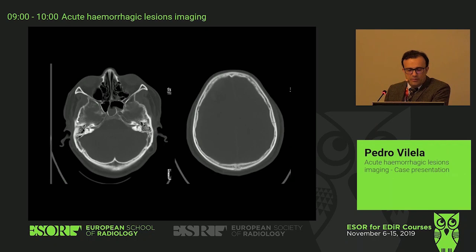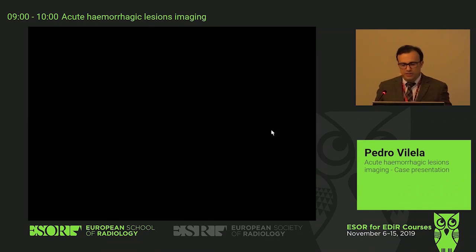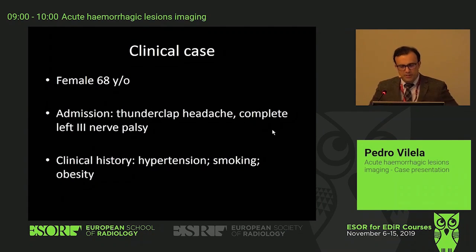But we are concerned about the middle ear, so actually the fracture was there, and there was a filling, and we need to look at it, and actually if we do the reformation, we see the fracture, temporal bone fracture, there, also with external auditory canal fracture, meaning that it was a very high impact lesion. Very good. So these are some pitfalls in trauma patients.